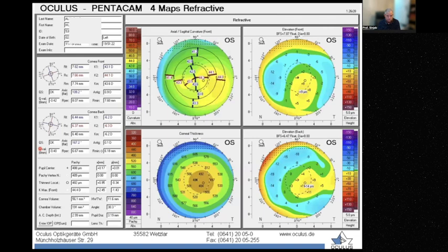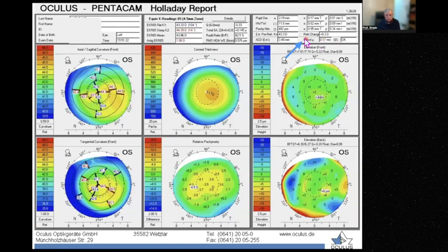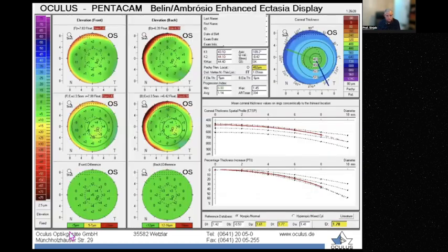This is the left eye. The left eye, against the rule, mimics the crab claw, somehow. And look at the pattern like this. So thin cornea, something not good. Chord mu is fine. Here it is consistent. Here it's normal, some yellow. So in general, you cannot say frankly it is keratoconus.